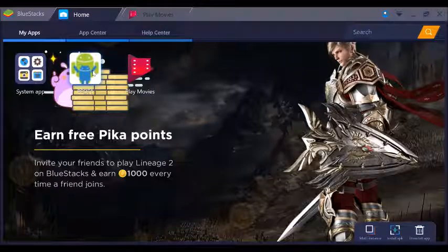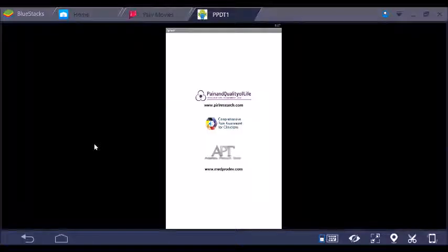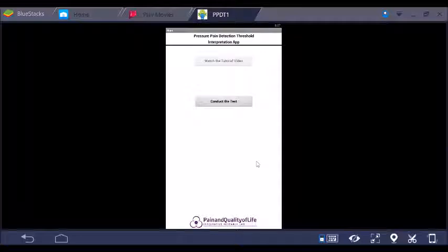If you open that though, you can see how the system works. So you're going to be presented first of all with this little splash screen, a goofy little video there with the link to the lab's website. Another splash page with a couple of other links, many of which don't work anymore. Then you'll be brought to the actual home page of the app.